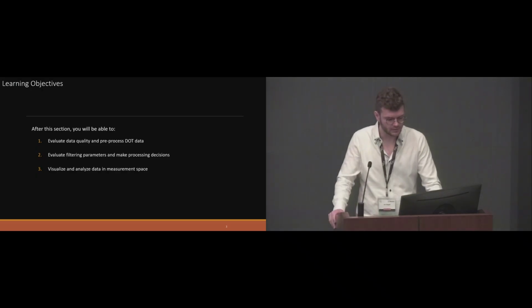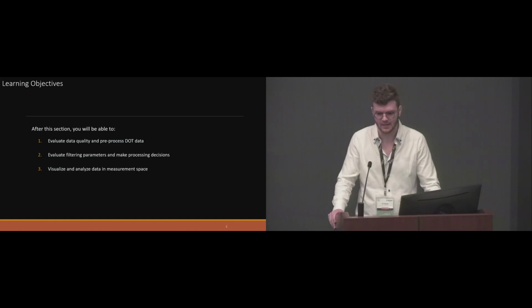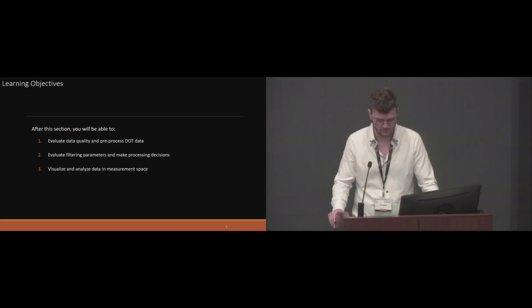So for our learning objectives, after this section, you are going to be able to evaluate some data quality and pre-process some DOT data, evaluate some filtering parameters and make processing decisions within the pipeline, and then also visualize and analyze DOT data in measurement space.